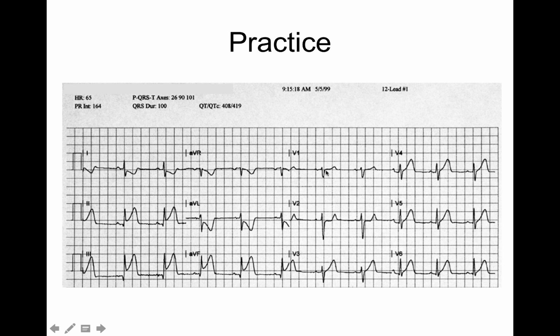V1, V2, septal, I don't see anything. Anterior, all, okay. You're going to see an elevated T wave. Okay, don't get this confused with the ST segment, okay. So this is indicative that there's something going on. It could be hyperkalemia that you're going to see this too, but with a heart attack, you're going to get a slurring. There's not a slurring or what we call a J point to identify. So no slurring present. We just have high peak T waves.